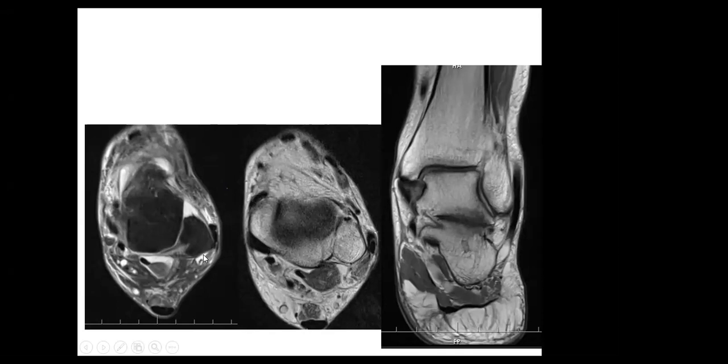Okay, there is fluid as well here, maybe some tenosynovitis. One of the risk factors for peroneal tendon dislocation is actually a convex fibula. You see the fibula is convex? Normally the fibula is concave, to allow the tendons to rest here. But when the fibula is convex, it's a risk factor for these tendons to dislocate and rupture the peroneal retinaculum.